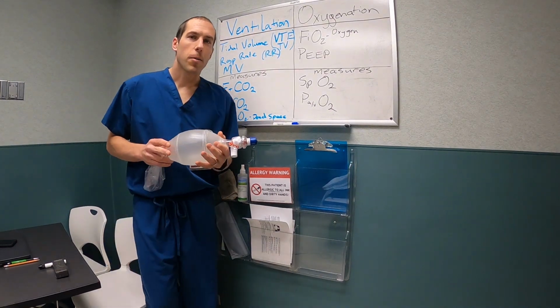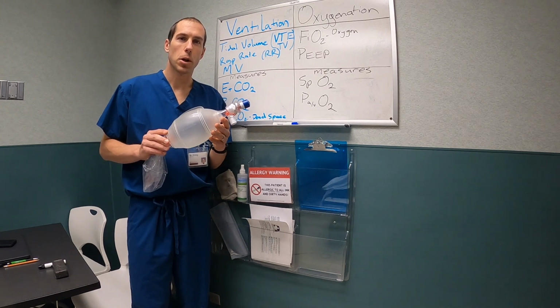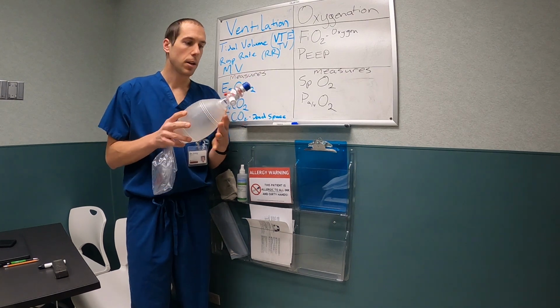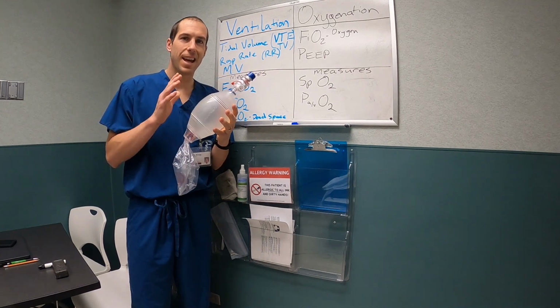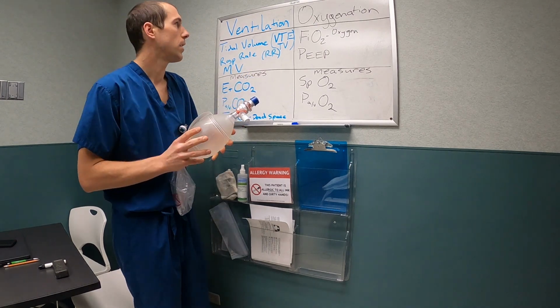So we want to talk about mechanical ventilation today, but when we do that, we want to start with our basic mechanical ventilation, which everyone is familiar with, which is the bag valve mask with PEEP valve. With this bag valve mask with a PEEP valve attached, we have everything we need to mimic the ventilator.